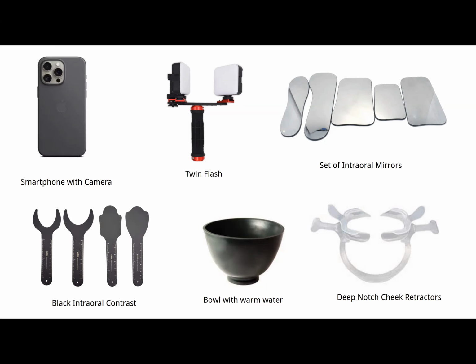Ideally, we want to use a professional DSLR camera, and there's a lot of them that we can use for this purpose. But the very basic thing that we can use is a phone, a smartphone. We can use a twin flash that has some diffusers, so there's not a lot of reflections coming up in the pictures. A good set of intraoral mirrors is important. These are the black intraoral contrast that we can use to take those pictures that need black backgrounds.